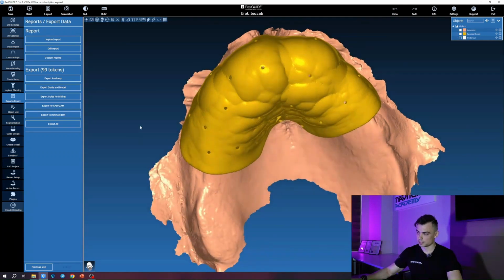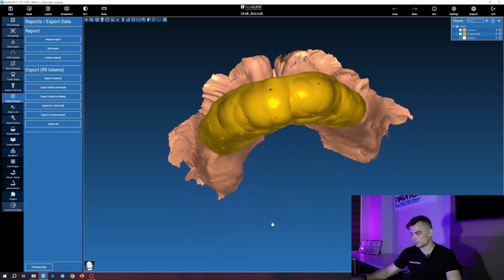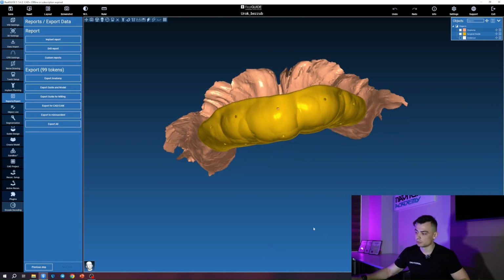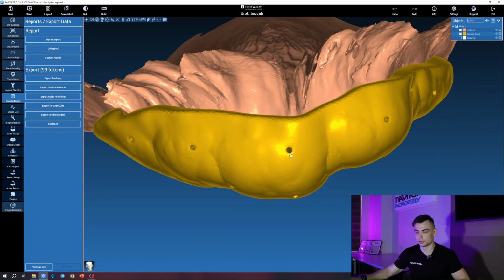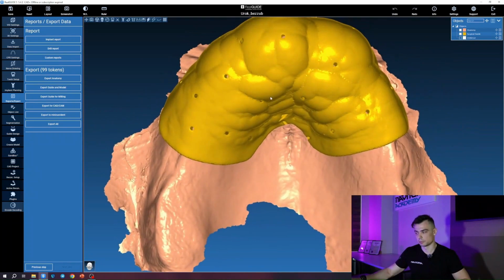So what else is there to say about this? Yes. You don't need to scan this template again. After the CT scan, you can just throw it away. And this is very good from a logistic standpoint and really makes the process much easier. And overall, aligning using these tunnels is, yes, a bit complicated, but it turns out to be much more accurate. Believe me, we've tried different methods, and in fact, for good reason. Now, for about 5 years already, we've been doing every edentulous jaw case using this method.